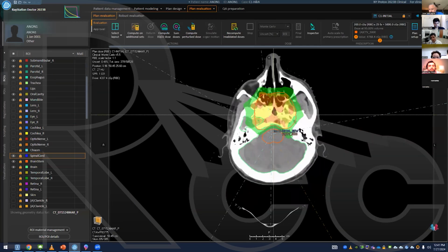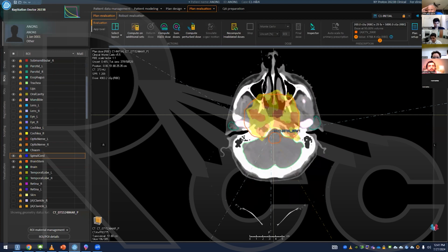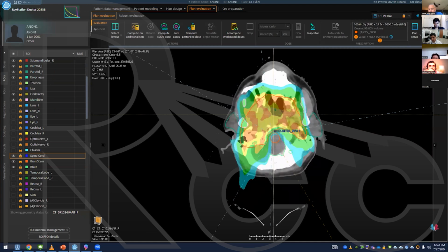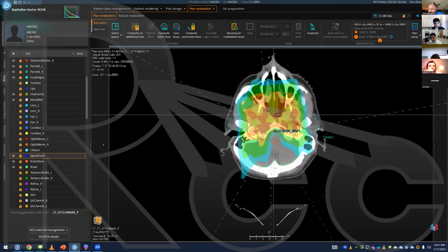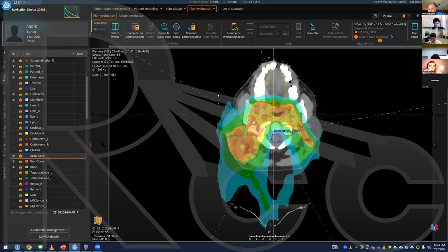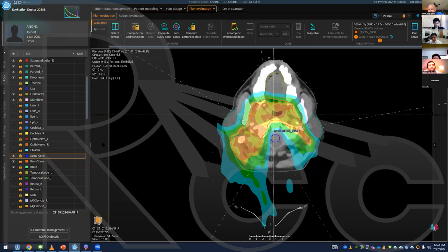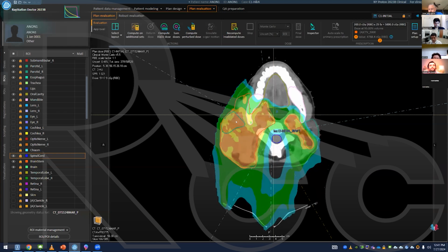So again, I'll turn this off, we see really good bending with the proton of dose away from the brainstem. Even though the clivus was involved and our target volume is going all the way there, the 95% is coming nowhere near our brainstem. So this is really excellent. You look at the parotids as well, and only a sliver is getting 50% of the dose, in blue, on the contralateral side. So this has been spared very well, and I'm happy with how well this has been pushed. The ipsilateral is unsalvageable. You have gross disease coming all the way up. So as Dr. Malik said, you tell the patient you're going to have fairly dry mouth because of loss of function on this side, and that's unavoidable given what we need to treat.